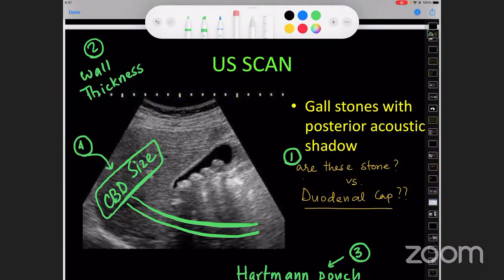Okay. The second question is, sometimes you have people coming in with asymptomatic stones, and they ask, is my gallbladder diseased? You see, in the days of old, where we had oral cholecystogram, you give the patient a fatty meal and you watch the gallbladder contract. Is there any way that can also be recreated in an ultrasound scan rather than having to go through a radioisotope scan of the gallbladder? So we can do that.